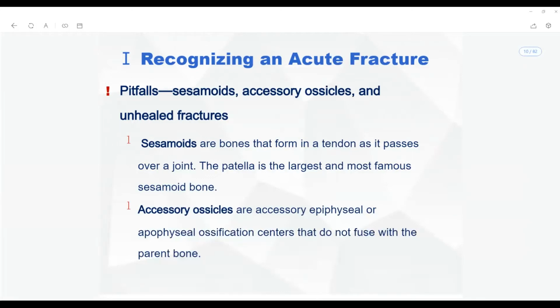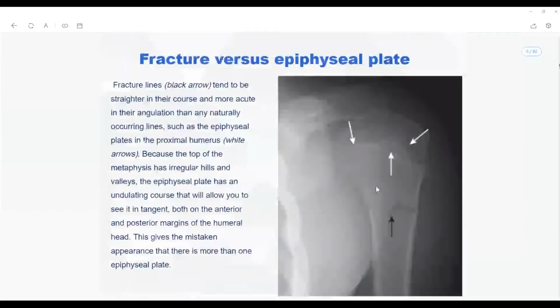So now in this image along the glenohumeral joint space, can you see those inflammatory signs? Hyperdensity, a lot of soft tissue swelling, or any disruption of the edges along the humeral head or the glenoid capsule? Yes, no, Benedict? Are they present there?